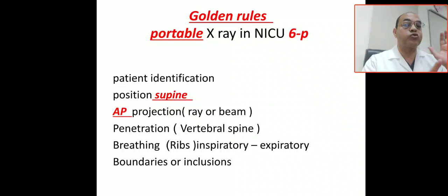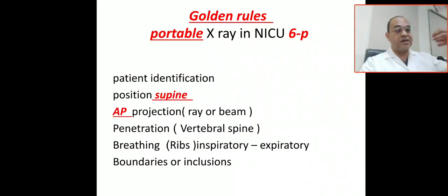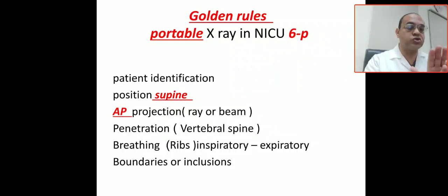Also the projection, or the ray, will be anteroposterior rather than posteroanterior. Anteroposterior means the rays enter from the anterior and exit posterior. So the X-ray will be anteroposterior.